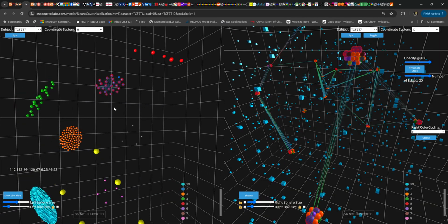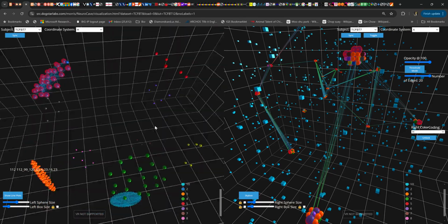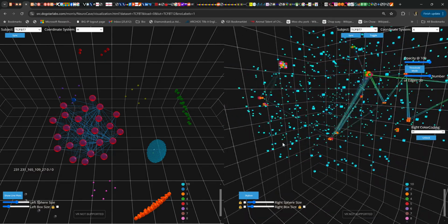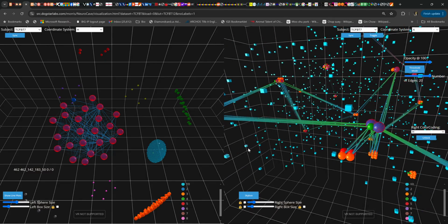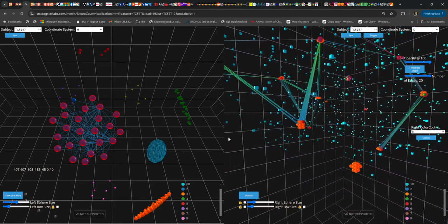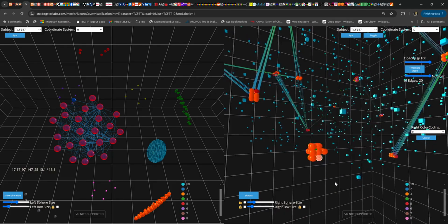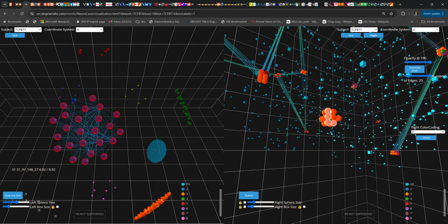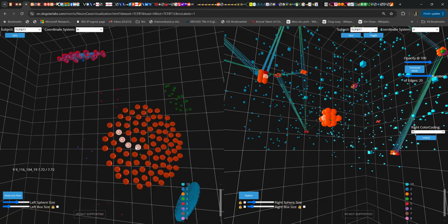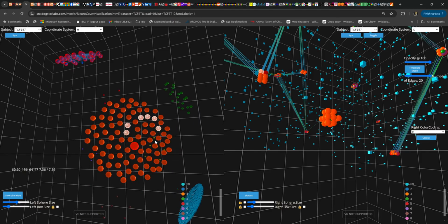That cluster is very cliquey. It has a very high clustering coefficient. Most of the tumors have members of that cluster in it, except regions of this tumor, which does not. It contains only these clustered cells. You can highlight them and you can discover which cluster they are. They're all this cluster. That's the most ubiquitous cluster.